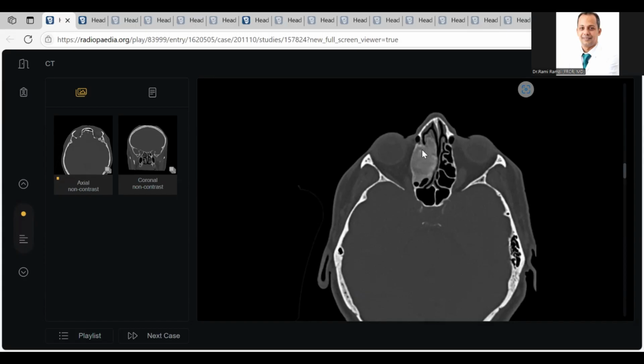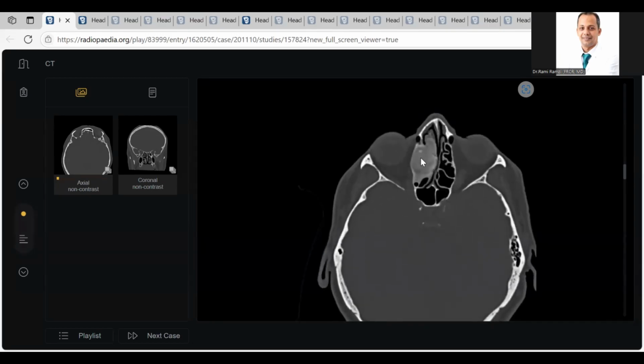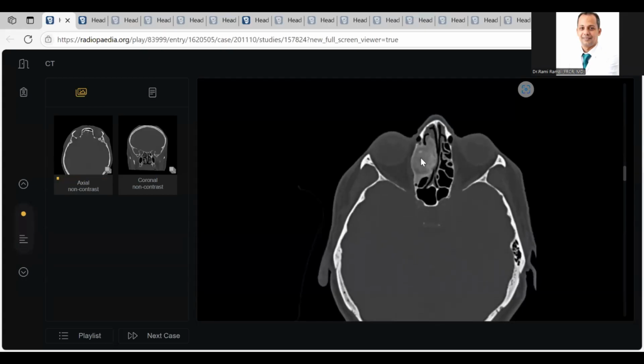Finally, loss of the normal compact cortex and the medullary architecture results in this abnormality. Why does fibrous dysplasia look like ground glass appearance? Who knows the answer? This is a very simple but very important question.